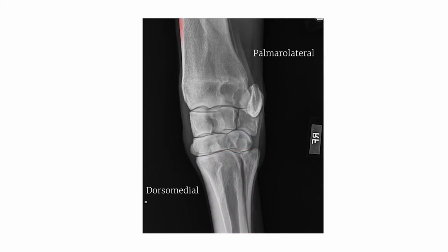We see the dorsomedial surface of the radius and the proximal and distal row of carpal bones. There are some chip fractures that are often located on this surface that can be seen in this view. The accessory carpal bone also has a distinct appearance in this view due to the obliquity of the shot, and you may hear some people say that it looks like a baseball catcher's mitt in this view.